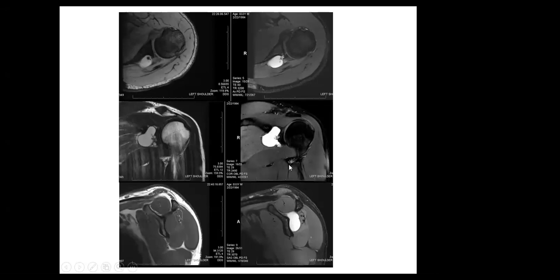So all in all, this is a paralabral cyst compressing the suprascapular nerve in the spinoglenoid notch associated with denervation myositis of the infraspinatus muscle. Okay, fantastic. You could also make a recommendation to do MRI arthrography, because it is the gold standard for labral tears. Yes. Okay, all right. Now, do you have another resident?